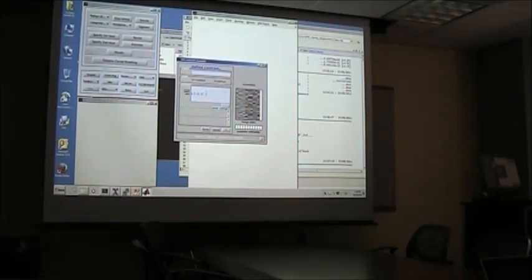SPM will make sure that it fills zeros everywhere else, but you would enter here the values that the beta values corresponding to each regressor will be multiplied with, right? By choosing your contrast values in a certain way, you can specify what you're interested in.